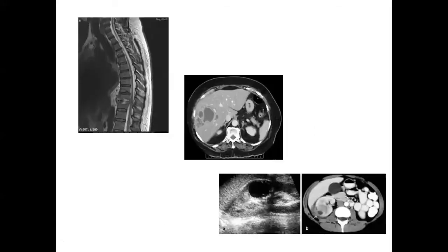Again, radiology is excellent for picking up certain types of infection, particularly when it forms a collection or an abscess. Clearly, radiology is negative in cases such as septicemia where there is no focus, but often, sometimes there is a focus. And here we have an MRI of the spine, and here we have high signal within this disc on T2 weighted imaging with a collection here and a collection at the back. This is a case of discitis or infection of the disc.